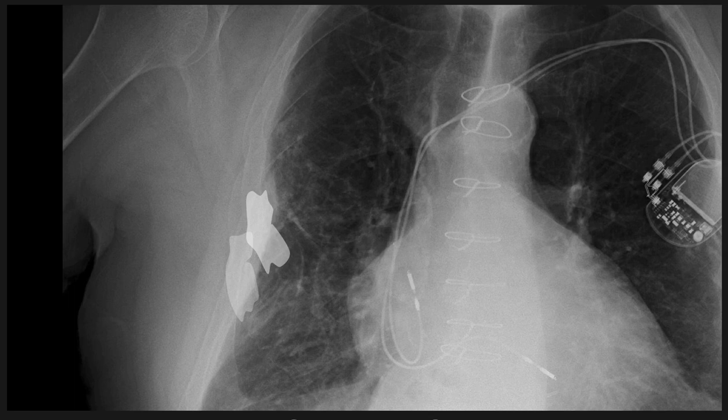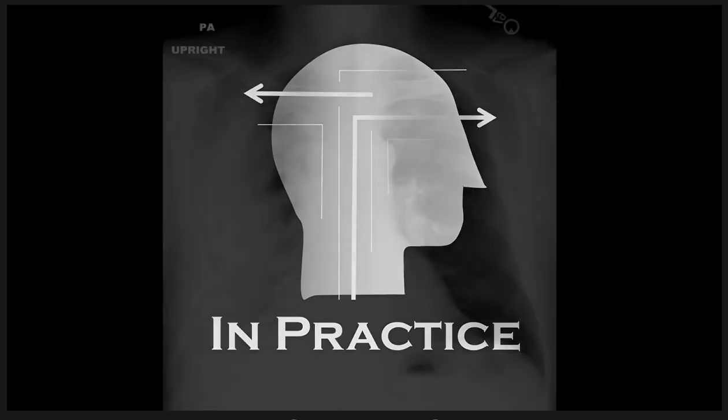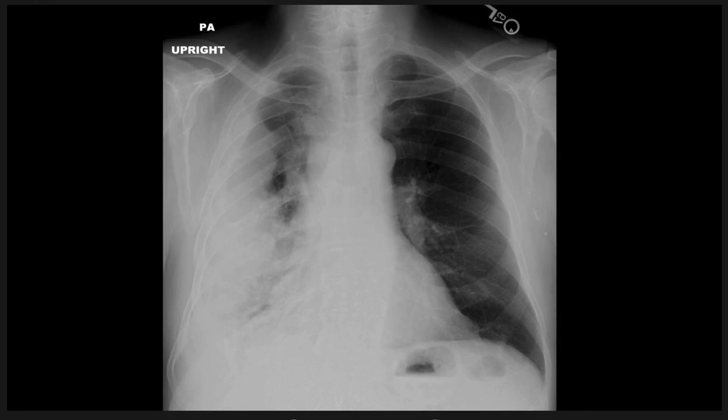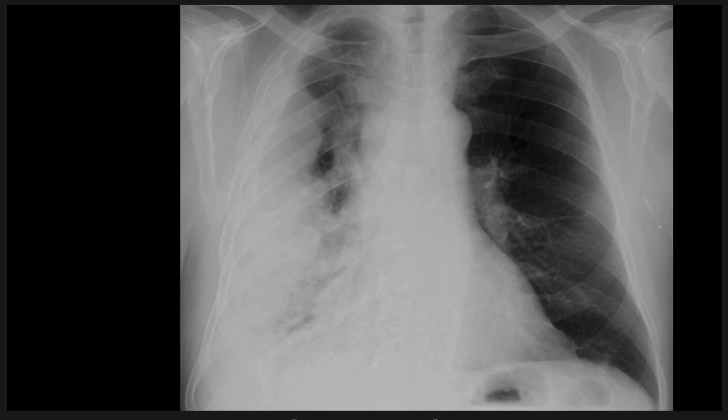some scar that's kind of mass-like, and that's why we're seeing that lateral pleural thickening like that. This is probably the most common cause to see a little bit of lateral pleural thickening. I want to compare that to this situation here, which is quite different. Again, we do have pleural thickening in a lateral location, but now it's mass-like, it's lumpy and bumpy.